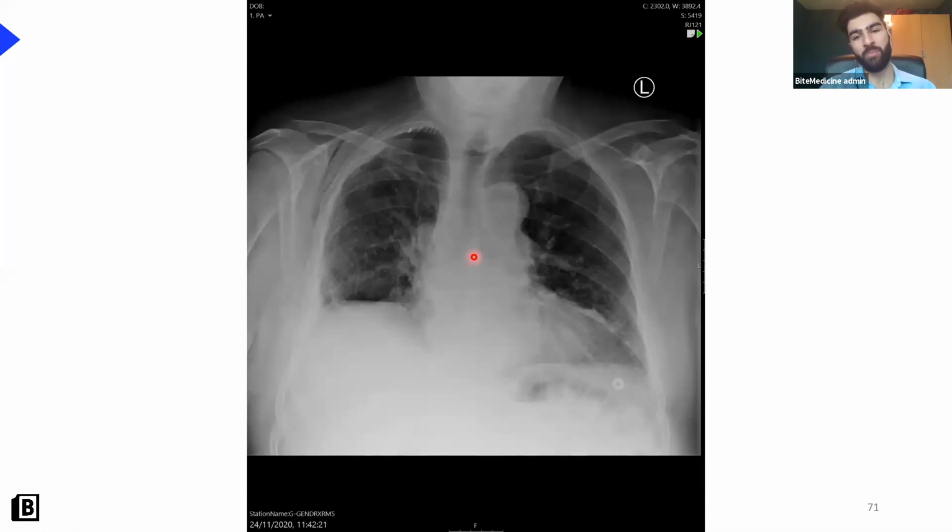Okay. Abnormality. Look very carefully. Remember, always look at what do you look for first? So that's my hint. You always look for lines and metalwork first. So think about what this could be. So we've got effusion. So if you see white, okay, interesting. Very interesting.